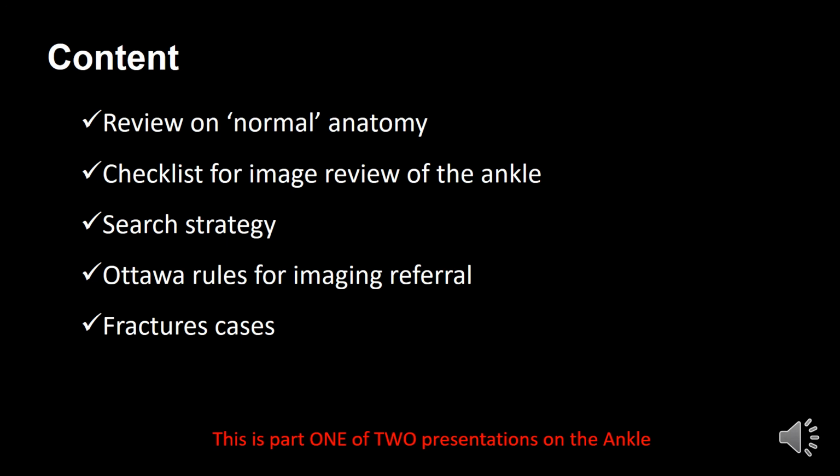Welcome to part 1 of 2 of the presentation of the ankle. In this presentation we will review the normal anatomy, we will propose a checklist and a search strategy for image review of the ankle, we will look at Ottawa rules for image referral specifically of the ankle, and then we will also present a series of cases with fractures to give you some experience.